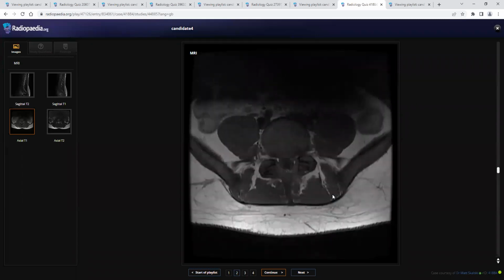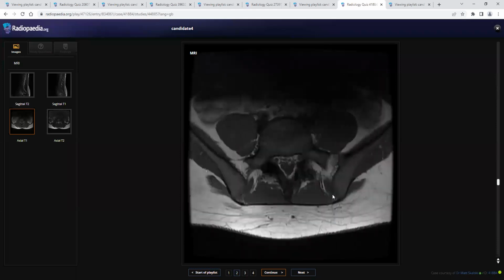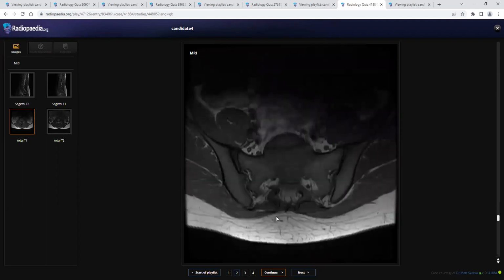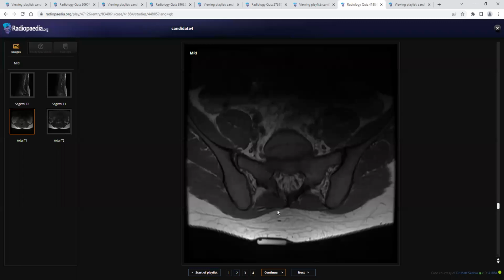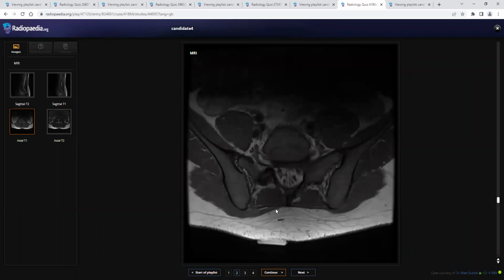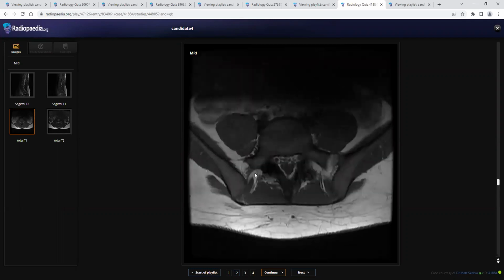The lumbar spine appears fine. No evidence of any obvious bony defect. Coming to the sacrum, there is some defect maybe in the S1 vertebra on the right side. The laminar defect is there. I don't see any obvious extrusion of any canal content outside, any lipoma or any lipomeningocele outside the spinal canal.